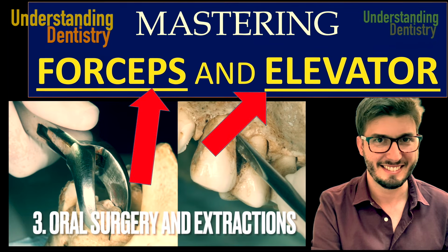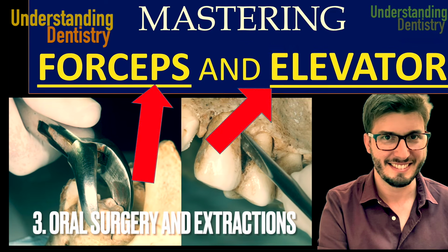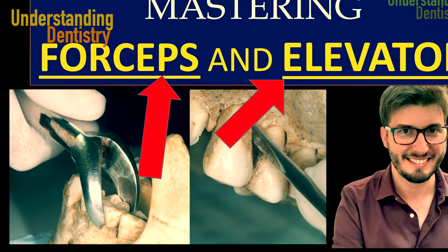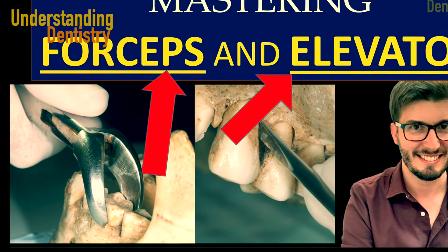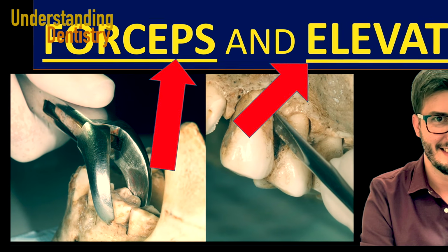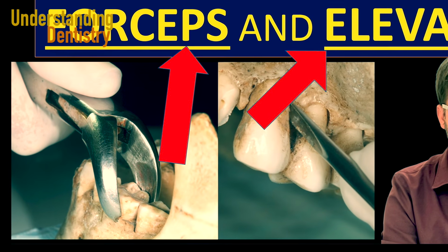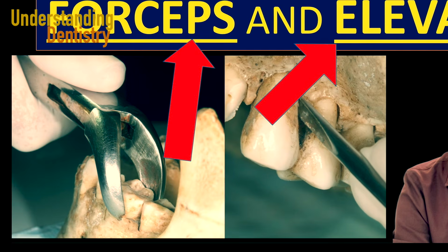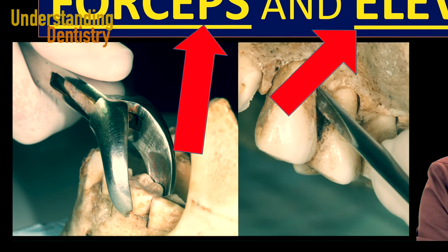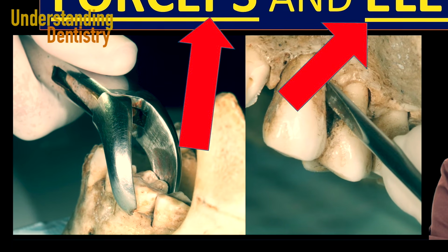For oral surgery, then we would have, of course, for extraction, the forceps and the elevator. This is a video very useful for you guys to learn about these instruments and about how to use these instruments. There is also the luxator, which is a sharp instrument that is used before the elevator, and you guys will learn this properly on those videos, okay? Especially how to use them. So try to watch them when you are a little bit more advanced in the dental course, for you to take advantage to improve your extractions, okay?